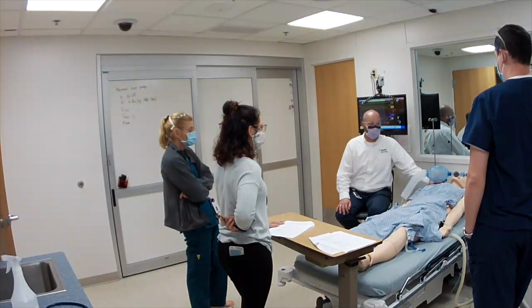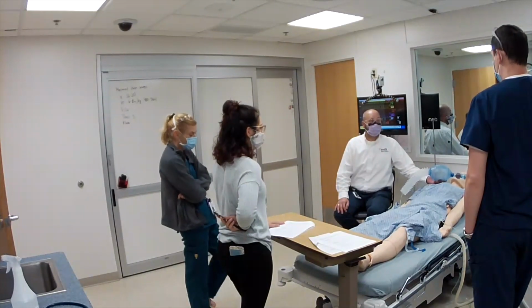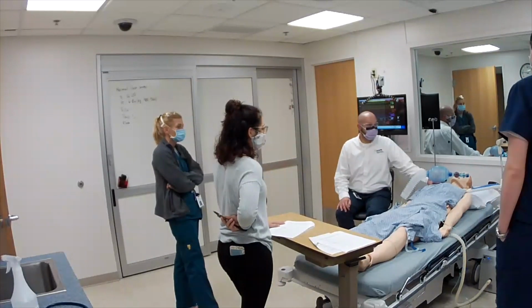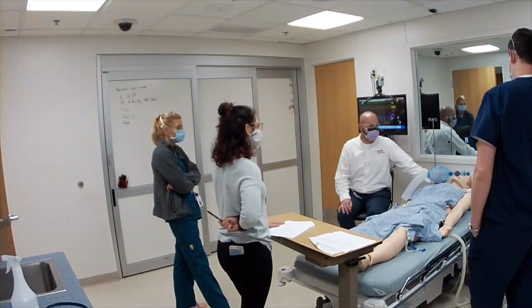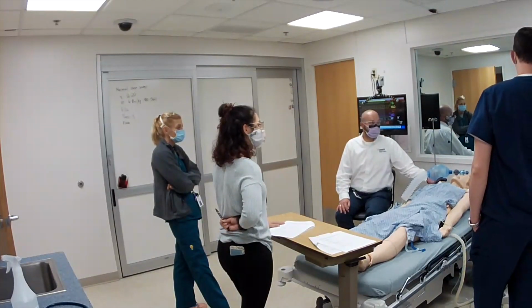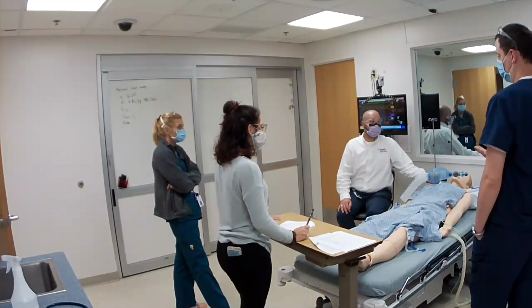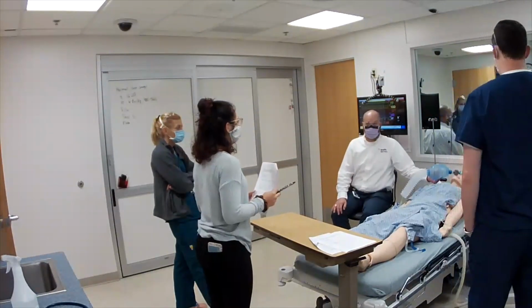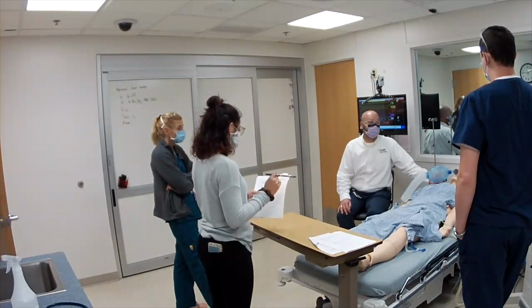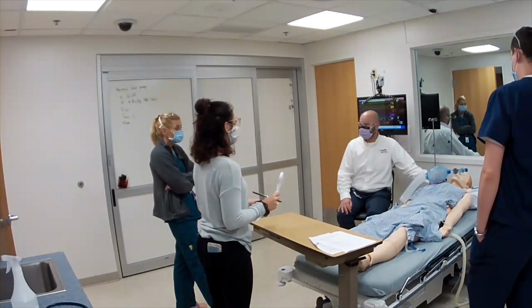Sure, absolutely. And what kind of patients would you put on volume control? Normal, healthy lungs. What's one other advantage of volume control? It's just safer because you know how much you're giving at every point. I would contend that one advantage of volume control is the vent's doing all the work. So this is ideal for a patient where we want the vent to do all the work. We're going to rest the lungs, and the vent's going to take over.